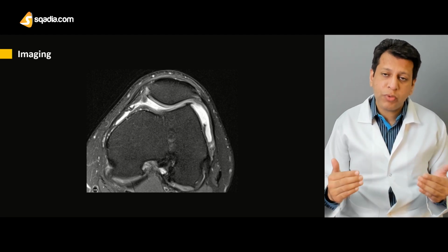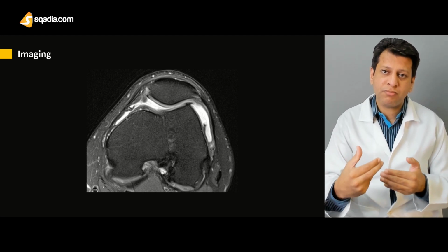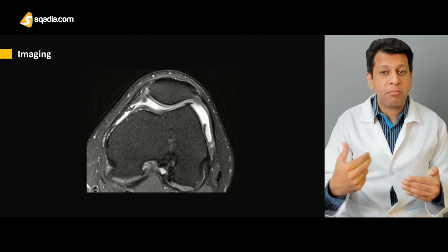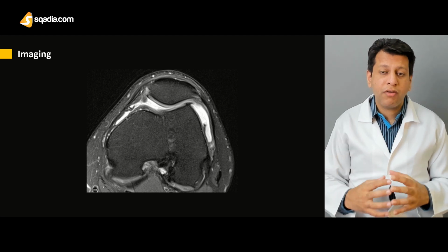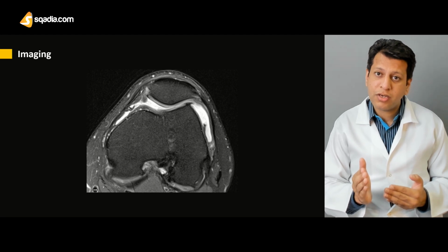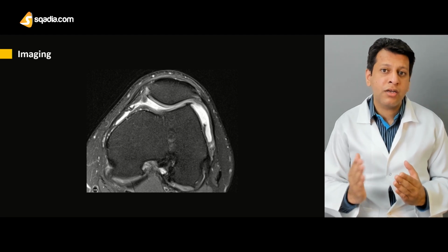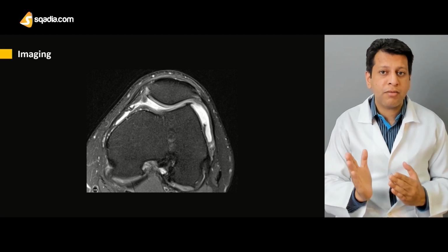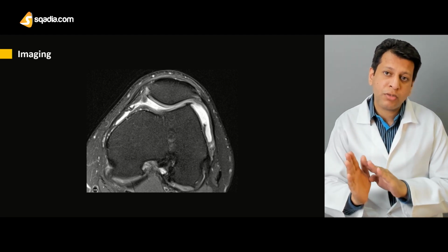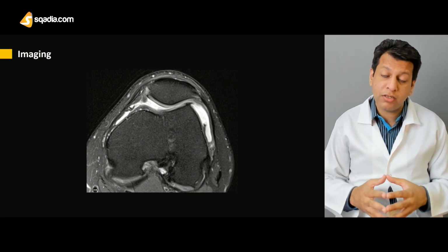If it is more than 20 mm, this means the tibial tubercle is displaced more laterally, more than 20 mm compared to the trochlear groove. For example, our patient also had increased tibial external torsion. This means the tibial tubercle was more externally rotated. This will push the patella more, because the patellar ligament would be more lateralized. Therefore, the forces acting would push the patella out laterally, predisposing the patient towards recurrent patellar dislocation.